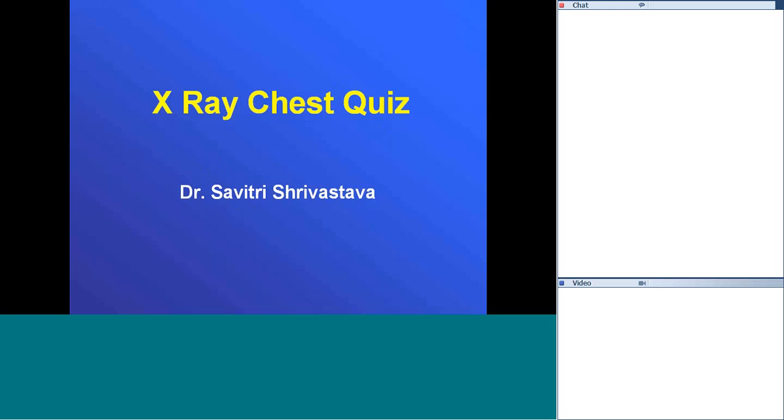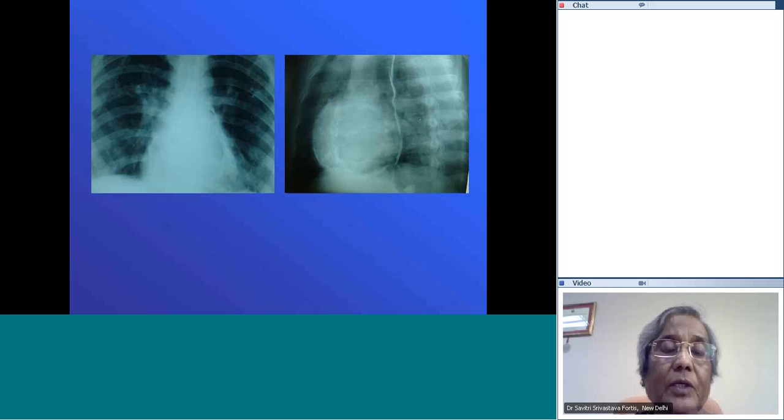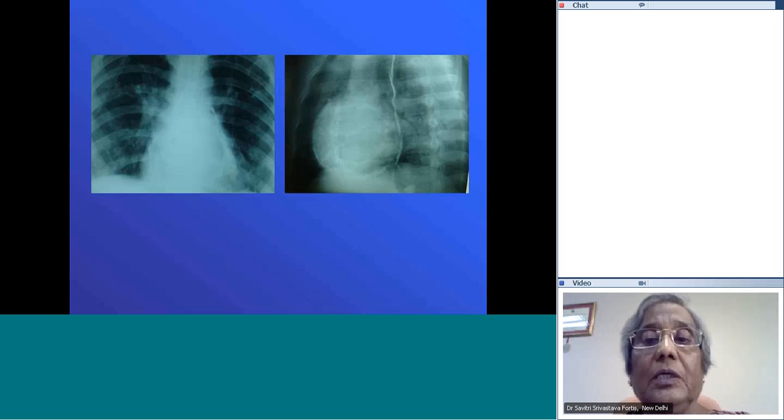I will be showing you the X-rays one by one. I'd like you to describe the X-ray and then give the diagnosis. So let's go on. Please describe the findings and then give the diagnosis.